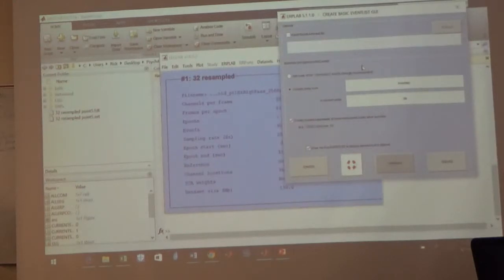Are these still good files? Or it was a folder, maybe it wasn't extracted from a zip file.